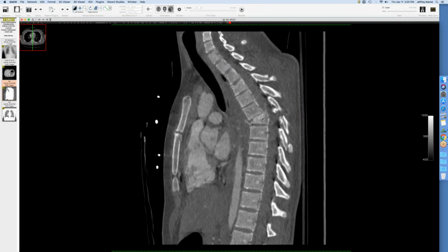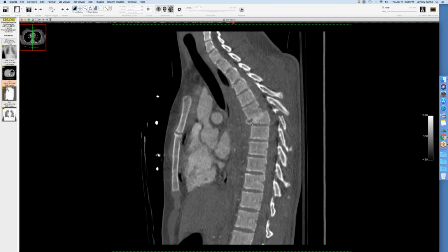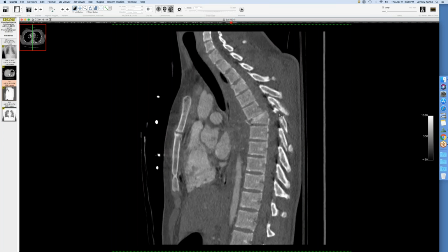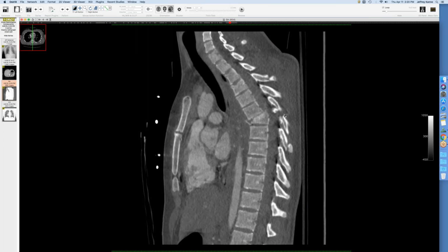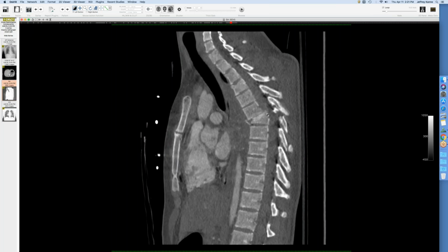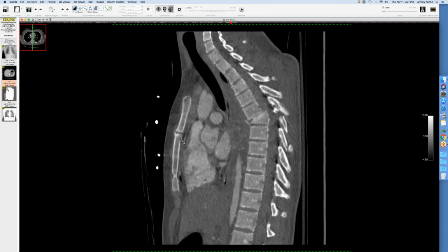This is a flexion distraction injury. So there's hyperflexion, which results in the compression deformity. There's tearing of the posterior longitudinal ligament, which allows this anterior listhesis here. You can see the disrupted cortex narrowing the canal, but there's also rupture of the facet joint. So that's the hyperflexion injury there. Unfortunately, it's associated with spinal cord injury, which these often are because of the narrow caliber of the canal in the thoracic spine, and also the extensive amount of force. I think he also has a little fracture of his sternum here, very subtle.